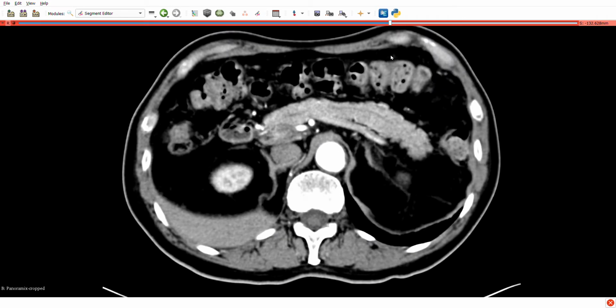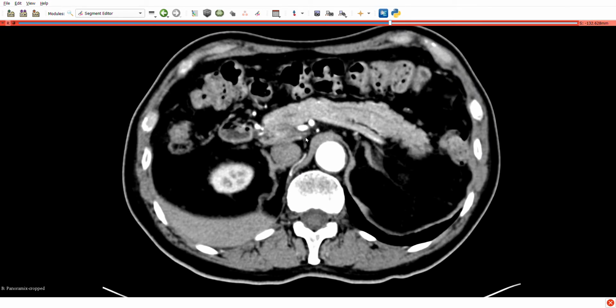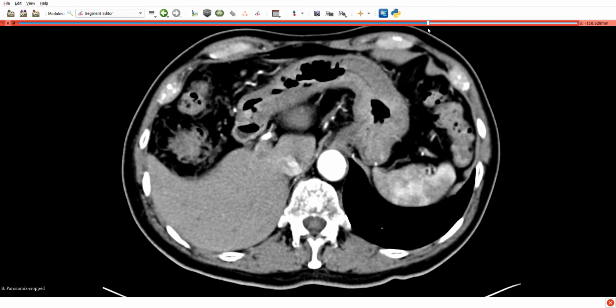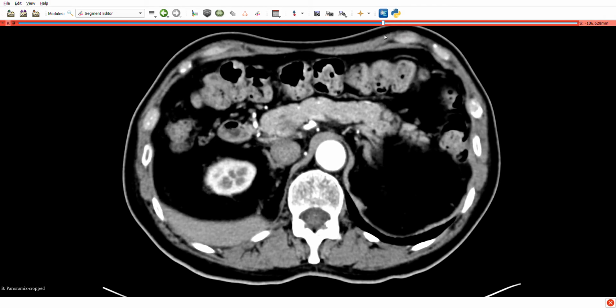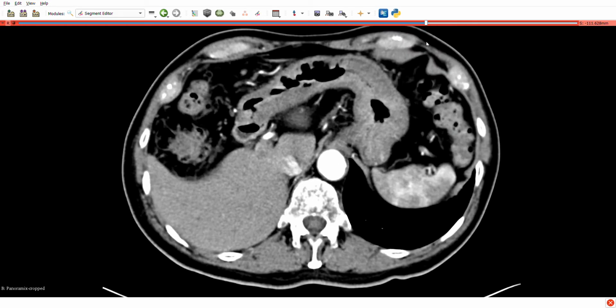So there we are. Now let me just point it out to you. Here is the point at which the celiac trunk splits into 3: common hepatic, splenic, and here is the left gastric. Now let's just follow it and see where it goes. Watch that little blob there and see the direction it goes in. And look, it's going towards the lesser curve. So at this point here we have the left gastric heading towards the lesser curve. So those are our 3 branches of the celiac trunk.